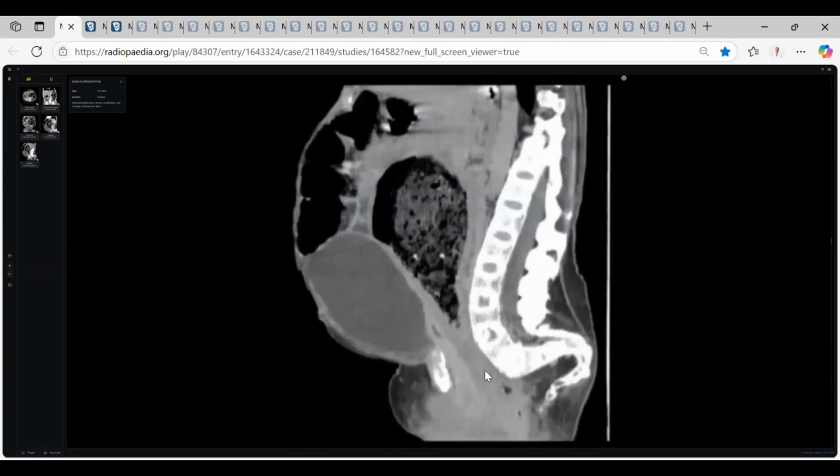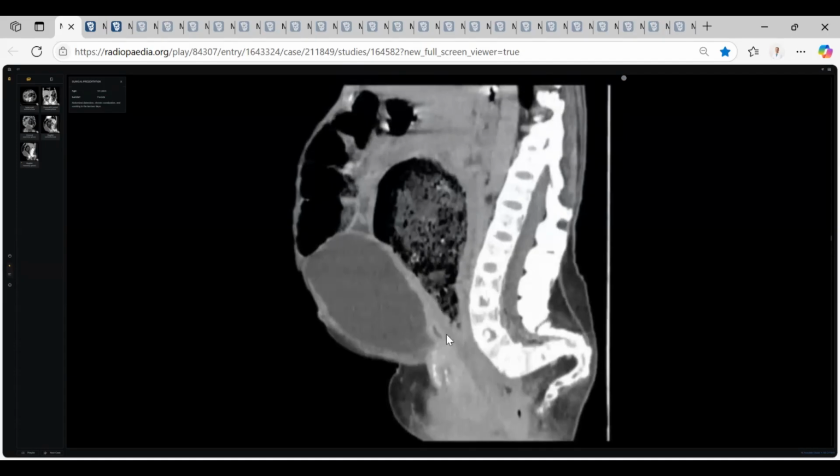Could you focus on this slice, especially what happened? What happened here? What is the name of this area? Area above it, markedly dilated sigmoid colon, and below it, collapsed rectum.